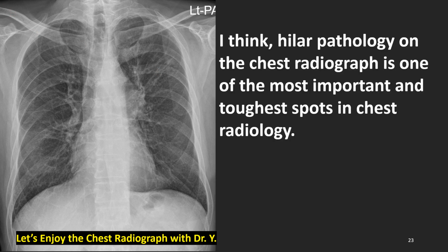Let's see this film again. If we meet this film again, what will you describe about this image? Normal or left hilar small cell lung cancer? I don't know. I'm afraid. What will I do? I think hilar pathology on the chest radiograph is one of the most important and toughest spots in chest radiology.